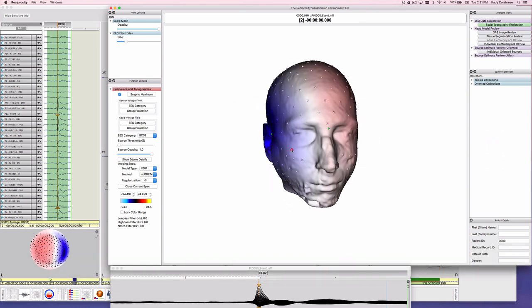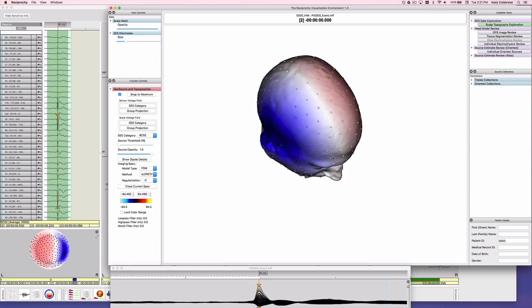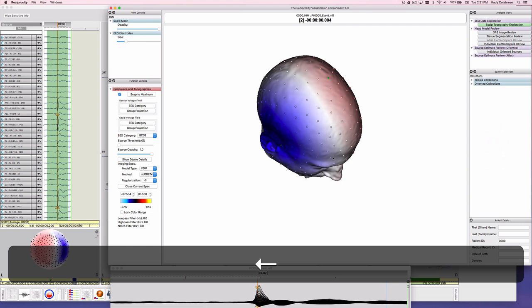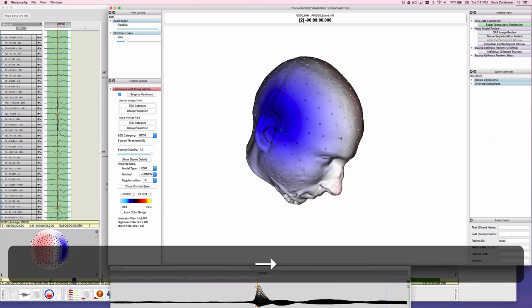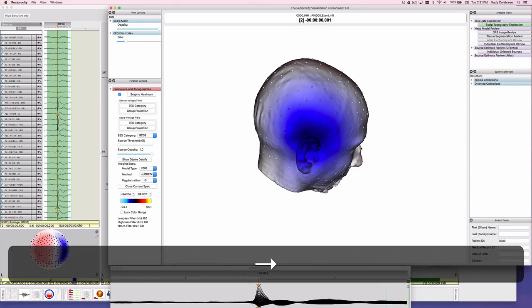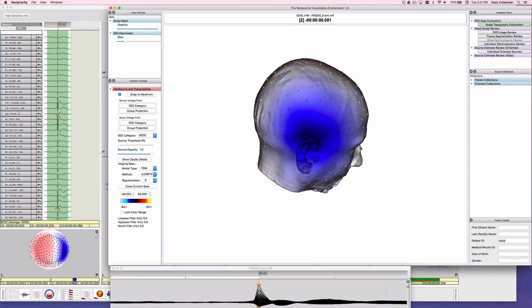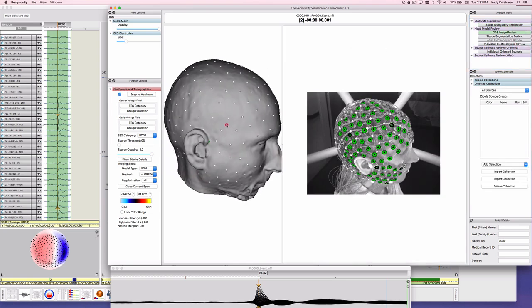Move through the EEG using the left and right arrow keys to nudge through the event. This will allow you to see how the topo map changes over time. Review the head model that was created in the MIP for accuracy in segmentation and sensor registration. This is helpful, especially if you did not create the head model yourself. Click on the GPS image to review the sensor registration accuracy for this head model. Use the same controls as in the Scalp Topography view to move the image around.